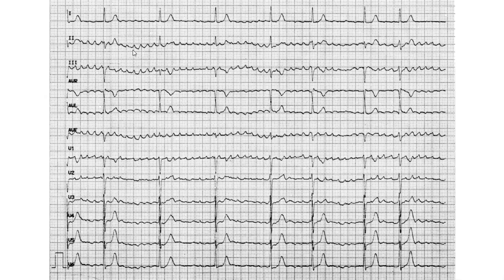Point 4, we describe these so-called P waves. They're not P waves now; they're F waves. But are they F capital or F small? Is it flutter or fibrillation? We calculate how many small boxes there are between the peaks, and we see that it's roughly 4 or 5. So 1,500 divided by 4 or 5. Let's just say that it's 5. If it's 5, we take 1,500 divided by 5, we get 300. Technically speaking, they did 4, so they got 375.